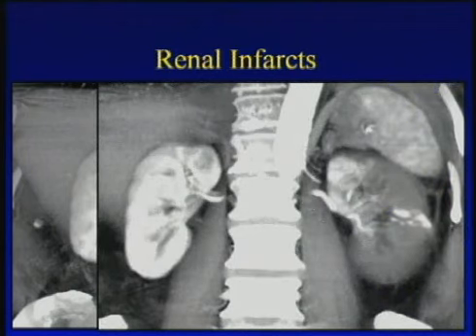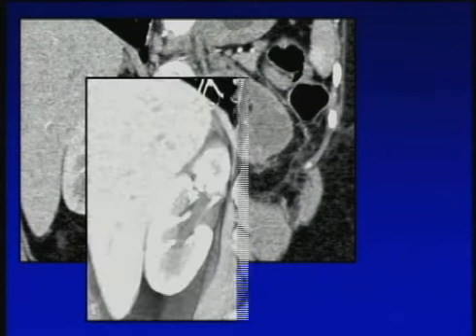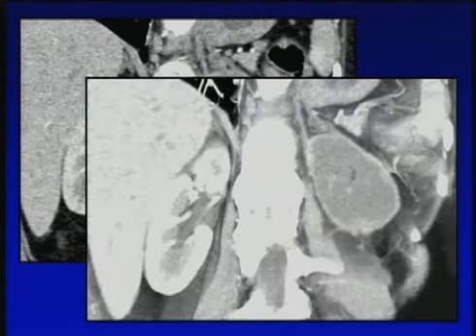So again, the ability to visualize the kidney goes far beyond simple axial imaging, but you need to take advantage of that when you look at the different phases. Or in this example, this patient was post-op from an aortic aneurysm repair, and you very nicely see the lack of cortical medullary interface on the left. Here it is another view. There's really no definable enhancement at about 30 seconds out in the left kidney.